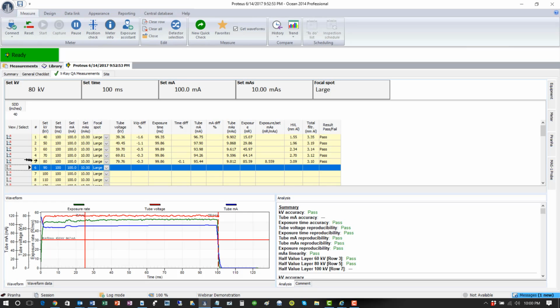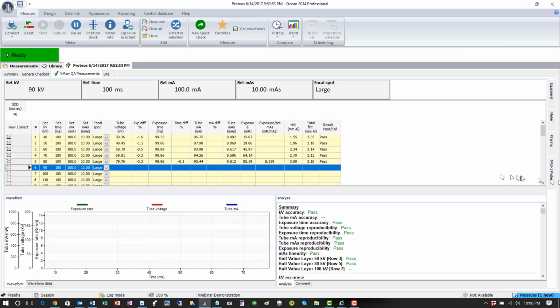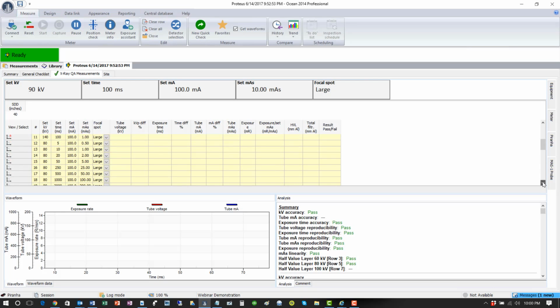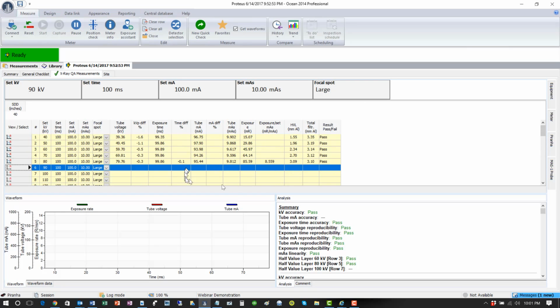Because I'm using this one exposure, number 5, combined with these other exposures down here, where I take 5 of them, and that's from row 20, 21, 22, 23. Those 4, along with that one shot, allow me to do lots of analysis on one exposure. I don't have to take many more of them to get the same results.